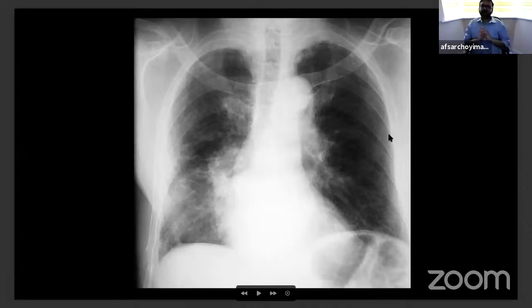The patient came with sepsis and all telltale signs of right lung pneumonia. And as you can see here, you straight away look for the right side, you see a consolidation there on the side of the heart, and you know it, and you found it. And then you can see there's a lot of haziness on the right side, but you know that it is rotated to the left. So that explains that.